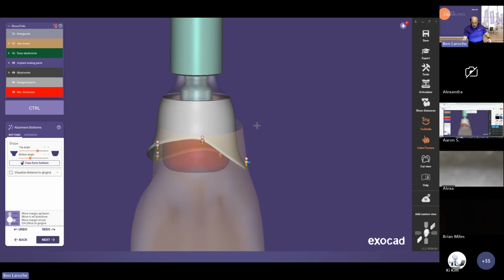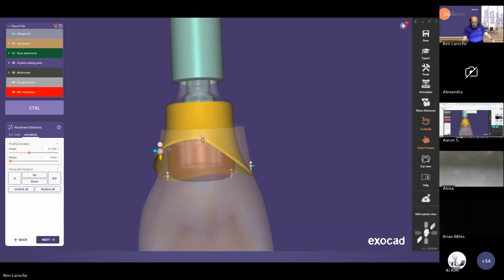profile. So see if I go top angle, and then I'm trying to create my ideal shape here. I can also come in here and freeform this. So I can actually add certain areas. I can make this bigger on my own in specific areas. Here, I can also go and adjust how those handles are.